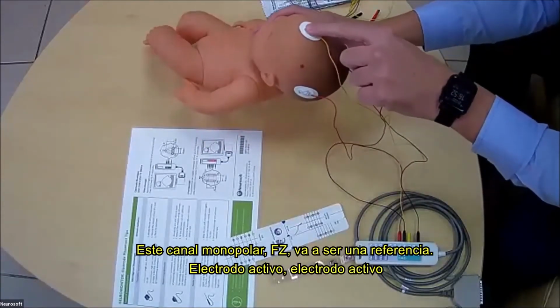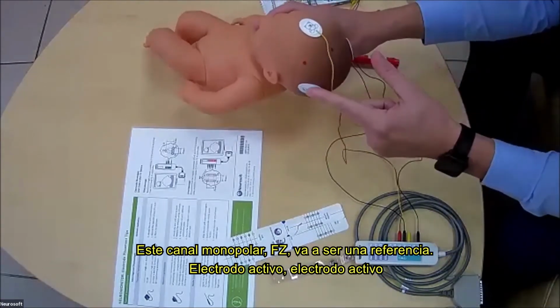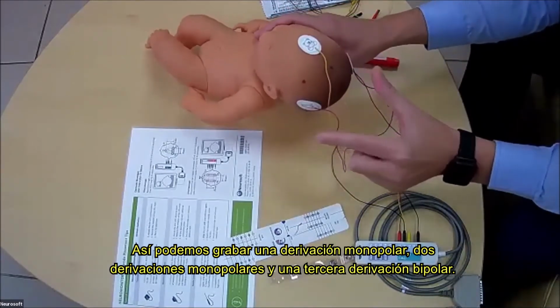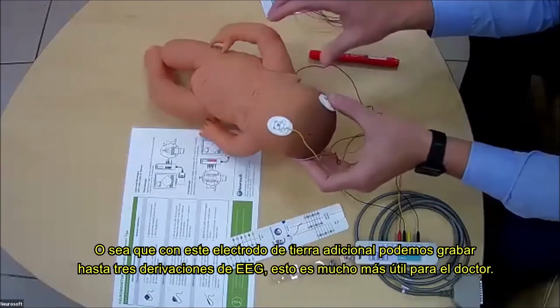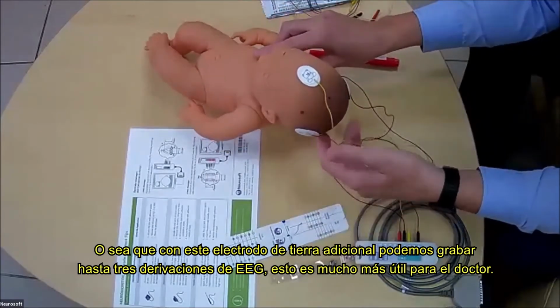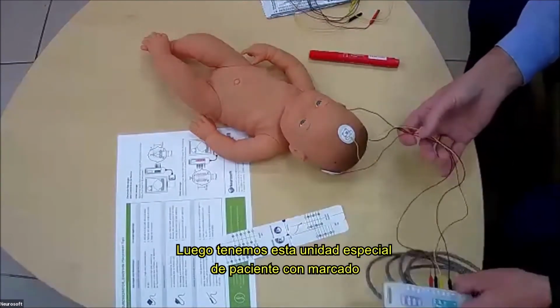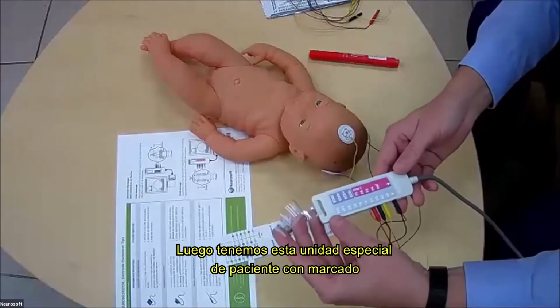This monopolar channel, this FZ will be a reference, active electrode. So we can record 1 monopolar derivation, 2 monopolar derivation, and a 3rd bipolar derivation. So with an additional ground electrode, we can record up to 3 EEG derivations. It is much more helpful for the doctor.